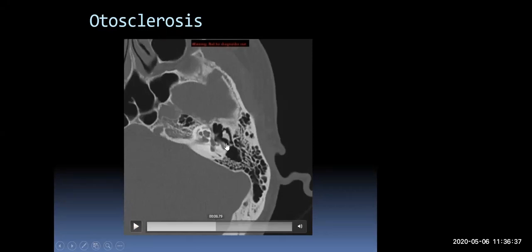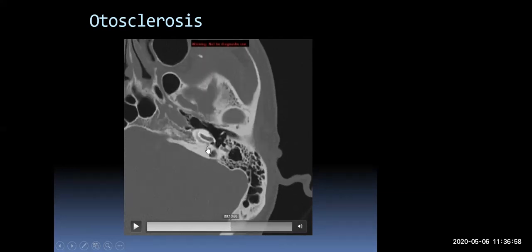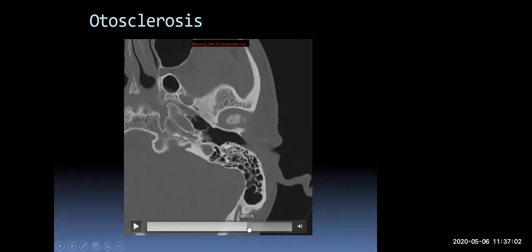Unfortunately, I can't do that on this image because these are exported images, but one really nice way for you to see these, especially when they're very subtle, is to invert the image black and white and look at the negative image. And these would be seen so much more beautifully on an inverted image than a regular white image. You can see the halo continues all around the cochlea here. Okay.